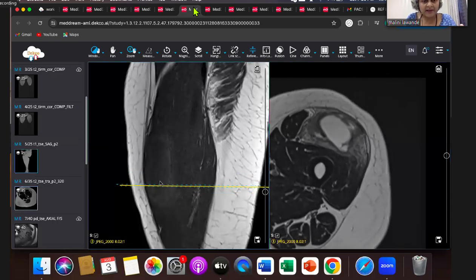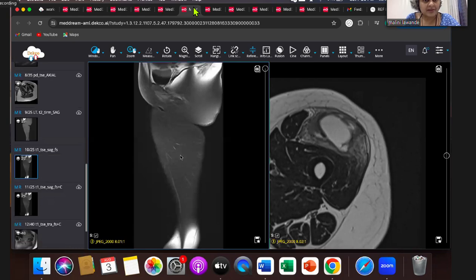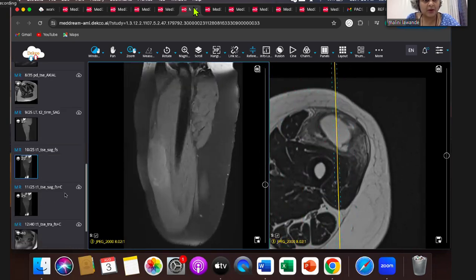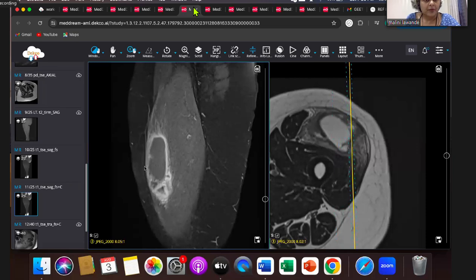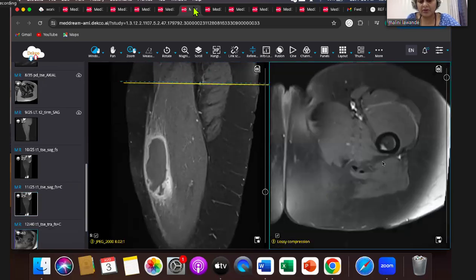And also on T1 weighted images, I hope it is projecting well, can you see a little hyperintense rim? Slightly bright signal at the periphery. The center is very hypointense. And then we have contrast. This is the plain scan, pre-contrast, and then this is the post-contrast scan. So after the contrast, what is everyone thinking?